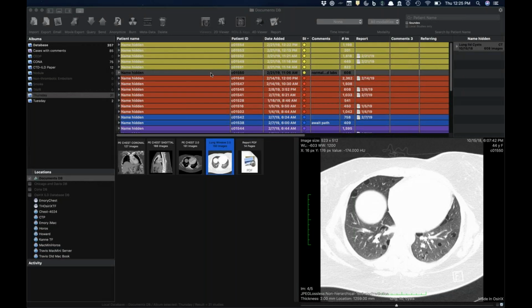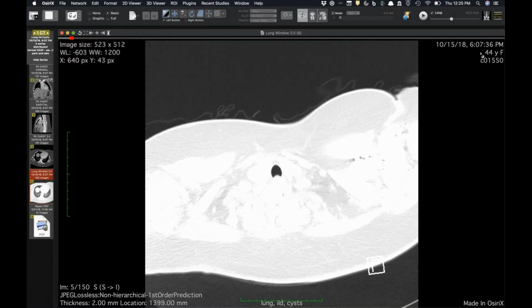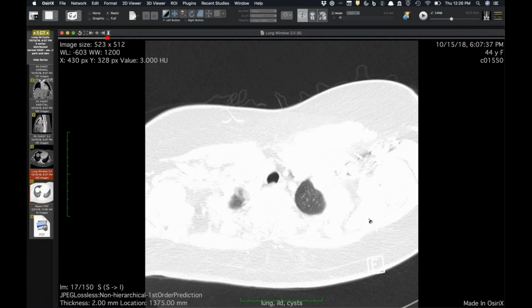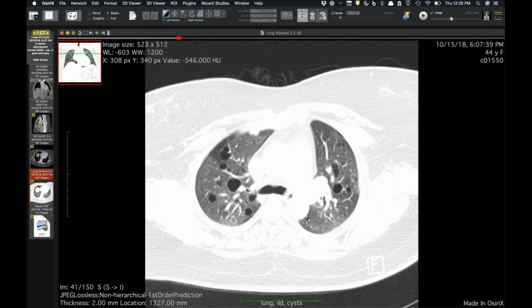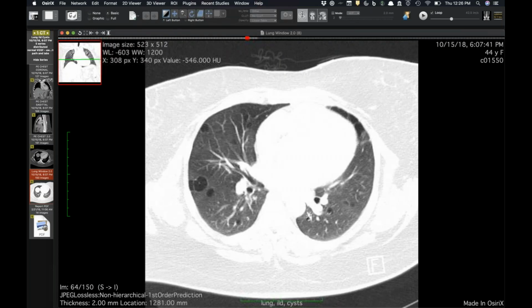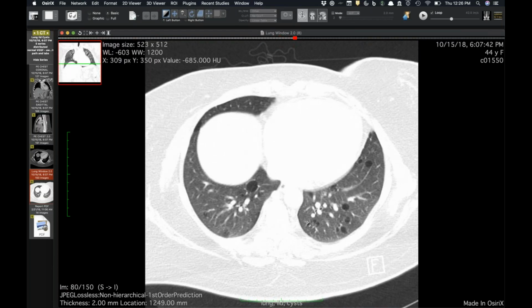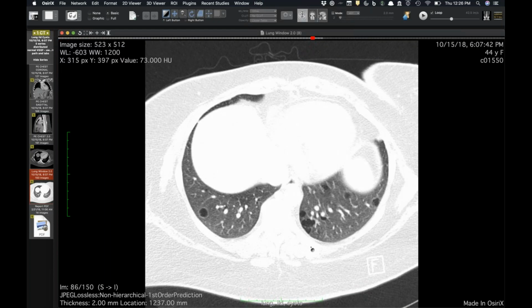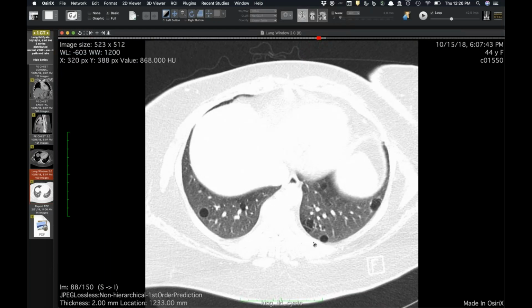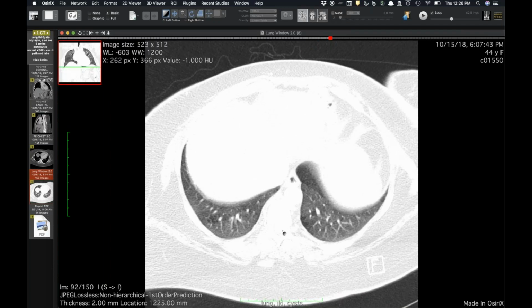Okay, we'll see how my connection is here. This first one I want to show, I want everyone's opinion. This is a 44-year-old woman who came into our ILD clinic last week, and she was transferred in with a diagnosis of LAM, not based on anything except the presence of all of these cysts. I'm going to pose the question, do you guys agree, or do you think that this is going to be something more like amyloid, LIP, light chain deposition?